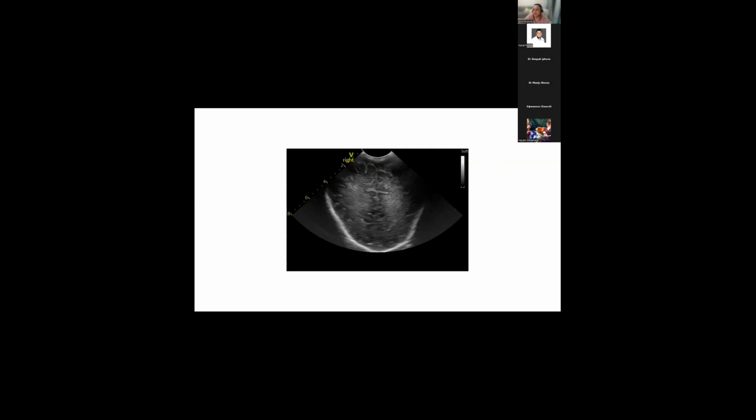Some people sometimes confuse this and think, are these cysts, these bits over here? They're not. They're just sulcal dropout that you see at the back. They're not cysts. It's actually the normal appearance. So just to say, I don't want to take your thunder away, because we've got a few people to present today.